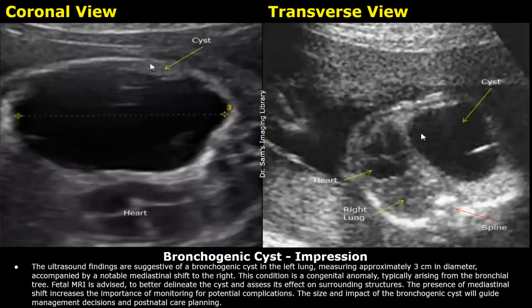Fetal MRI is advised to better delineate the cyst and assess its effect on surrounding structures. The presence of mediastinal shift increases the importance of monitoring for potential complications. The size and impact of the bronchogenic cyst will guide management decisions and postnatal care planning.